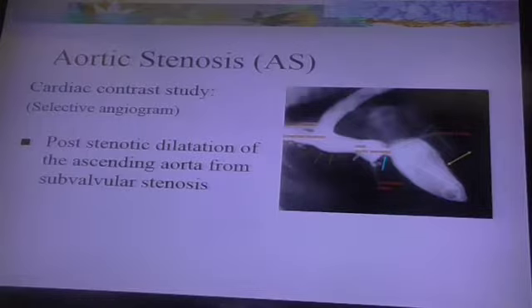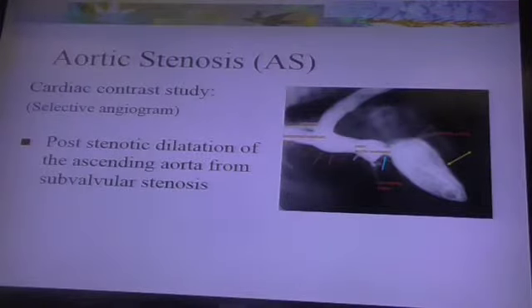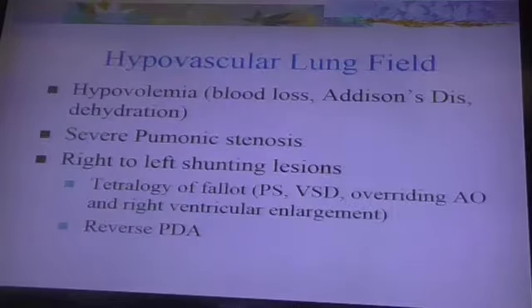And notice again where it's located, so then you would see loss of the cranial cardiac waist. Hypovascular. Okay, were there any other questions on that? Okay, I think you all just wanted me to repeat that.